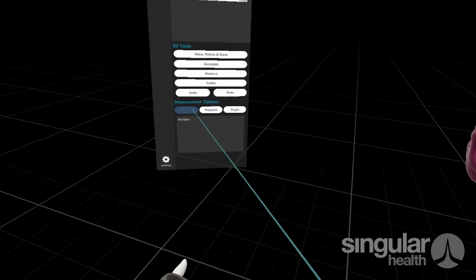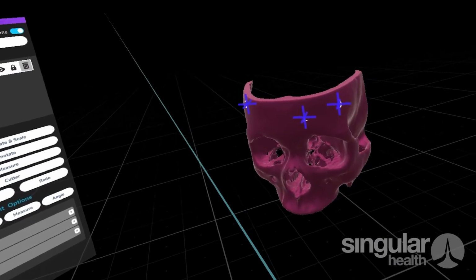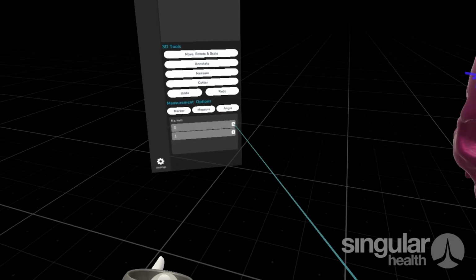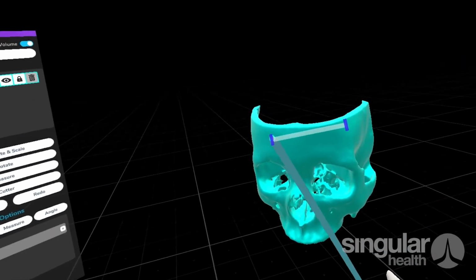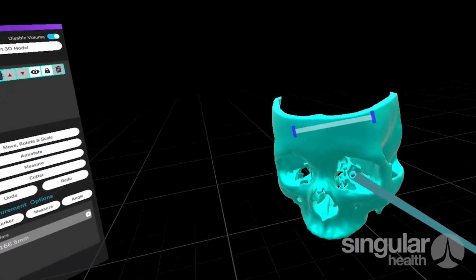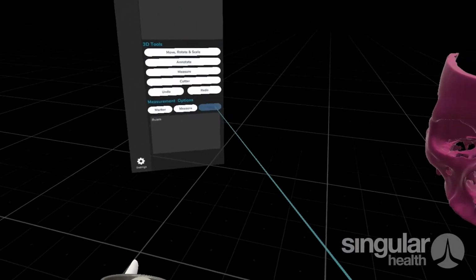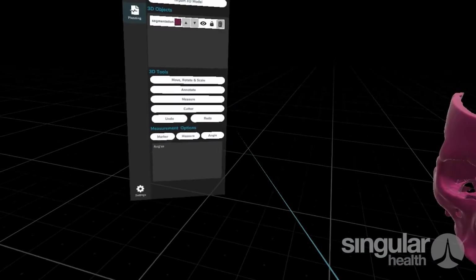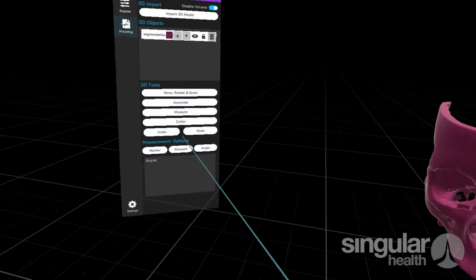Next up we'll go for the measurements. So very similar tools to before. You have all the marker tools letting you mark up the mesh, and then everything's represented at the same time. We'll go to measure, so it lets you draw measurements. On here it will display the measurement. I actually think the measurements just combine the mesh. And then obviously you can do angles as well. Everything can also be undone and redone at the same time using these two buttons down here.